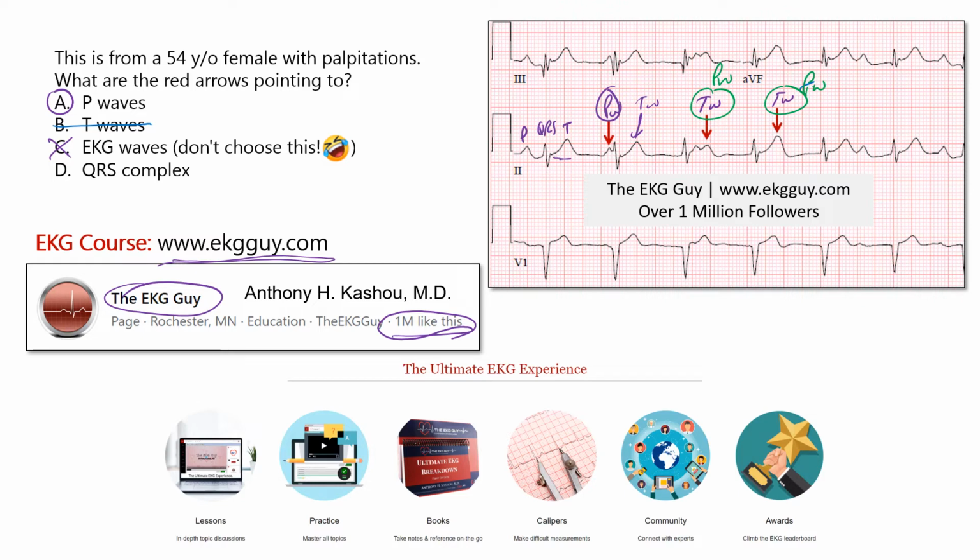If you look at the complex that follows, notice this is a T wave, and then this right here would be another P wave. And then all of a sudden your T wave looks back to normal like it did in those earlier ones. And then this complex, this is a P wave as well. So hopefully that makes sense.